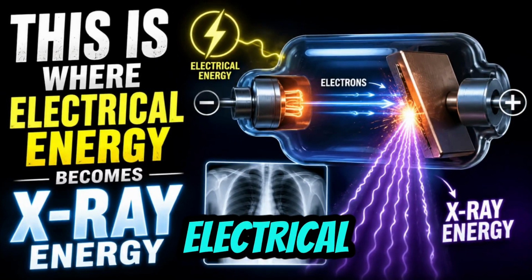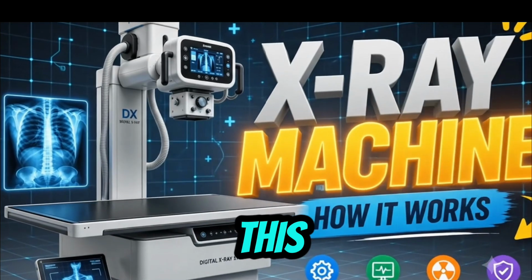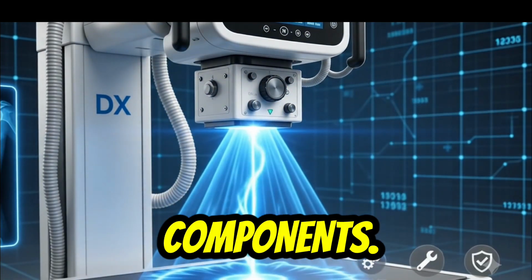This is where electrical energy becomes X-ray energy. Hello everyone. In this video, let's learn how an X-ray machine works and understand its main components.